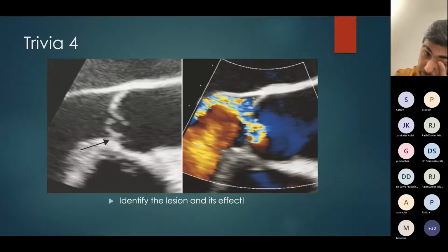So coming to another trivia, identify the type of pathology here and what are its effects.